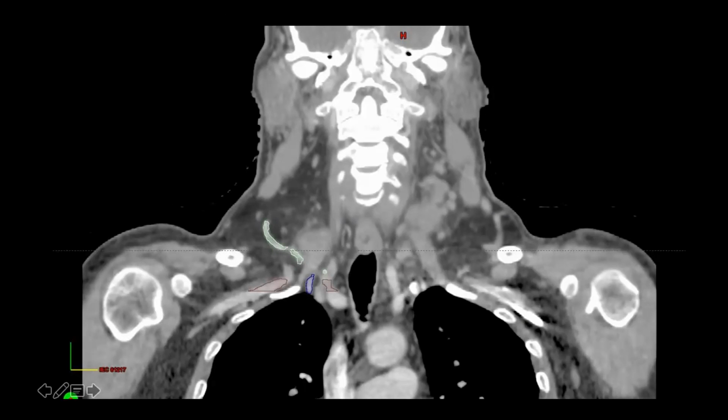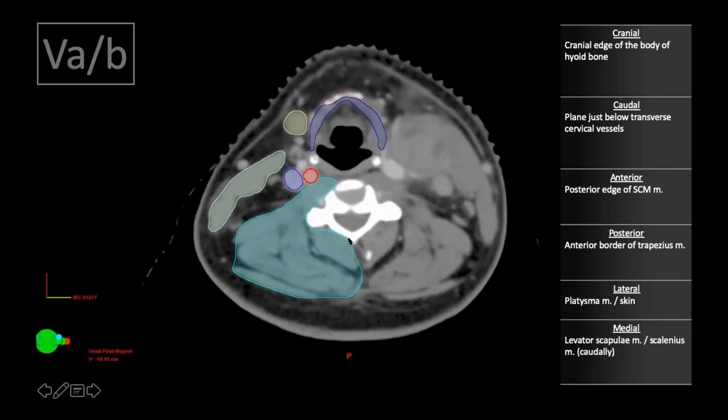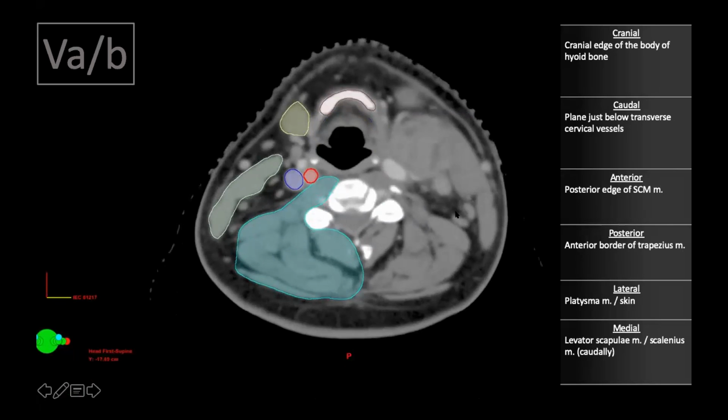I hope that solves the doubt of that candidate. So one of the candidates wants to see the levels in your CT scan in the area where the node was positive, when there was a gross node with ENE, I believe. However delineated those levels, I don't think that side is delineated, is it? But then how would you delineate those levels? Whether you would allow your contours to go into the adjacent structures. I don't think a gross node delineation is part of this topic. Yeah, we were discussing elective nodal delineation, but anyway, since it's a doubt, we'll clarify it.